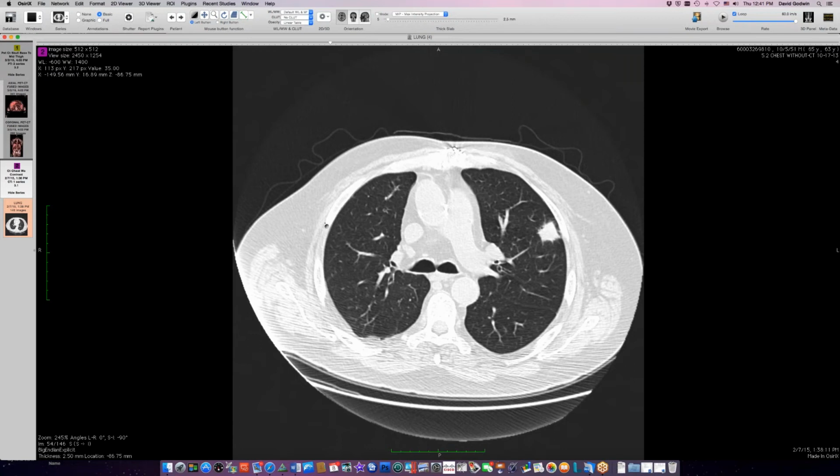David, was the diagnosis made by CT-guided biopsy or endobronchial? I think it was biopsy? CT-guided. Yeah. I can check. Does that help? I mean, is that it? I was just curious, and of course, the PET was done after the CT, I assume, because it really doesn't add anything, in my mind. Yeah, it doesn't, but I wasn't going to throw it out.